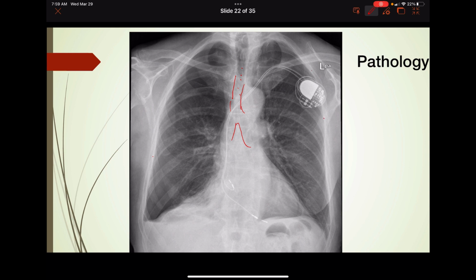I don't see any. C for cardiac silhouette, can't see the right side. D for diaphragms. This diaphragm looks okay, gastric bubble. This diaphragm over here you can see has a pleural effusion going on. This is probably diaphragm here, but definitely has fluid in there.